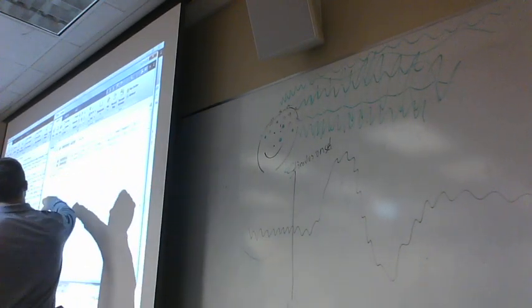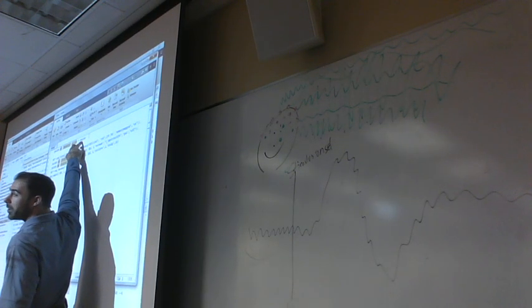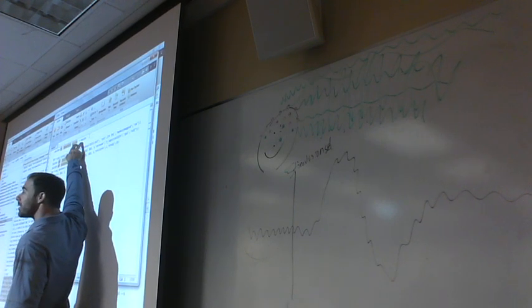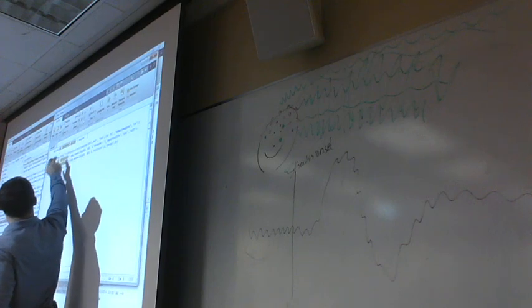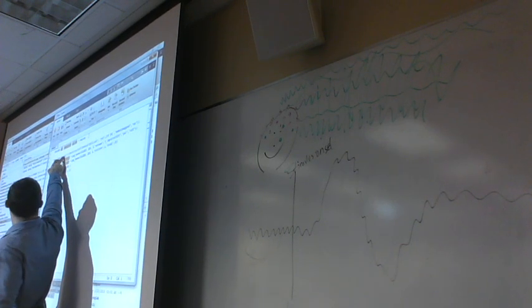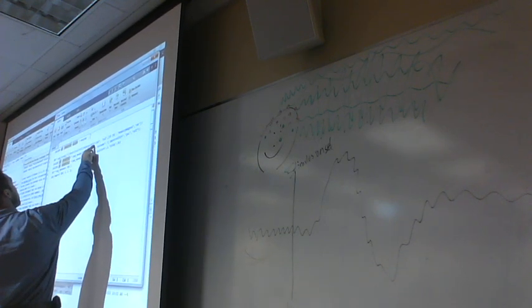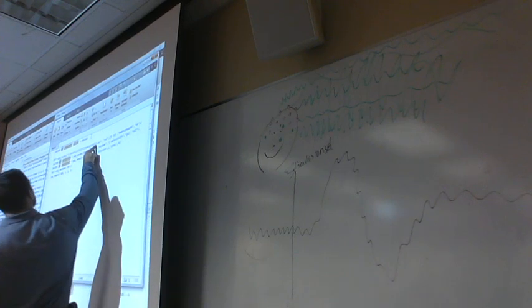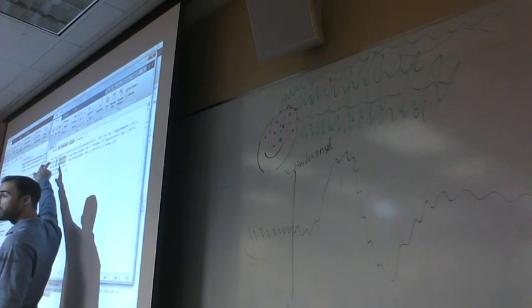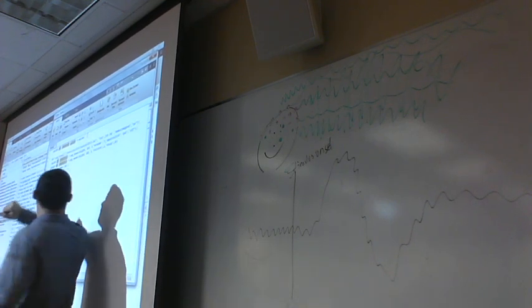Let's take a look. The first thing our history tells us is we typed EEGLAB. Duh. So we know that it's right. It's tracking us. It's kind of like the NSA. Now the next thing we did is we used that biosig function to load in our data. So what does it do? We loaded in our data. Here's our directory, and then there's our file. So it's file 3.bdf, and it was within this directory. Make sense? So this isn't all gobbledygook. We're going to make it really understandable.